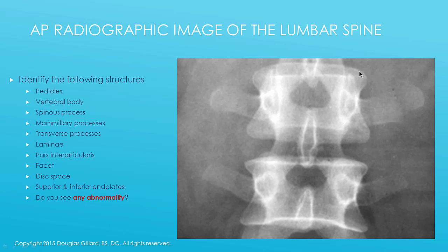Now you can see the inferior articular process here of the bone above coming here. Okay, it's meeting with the superior articular process. You can see right here of this bone. Okay, so that forms the facet or the Z joint. Let's get to the numbers here.